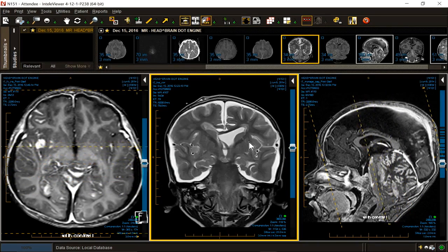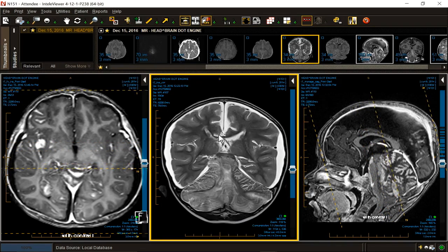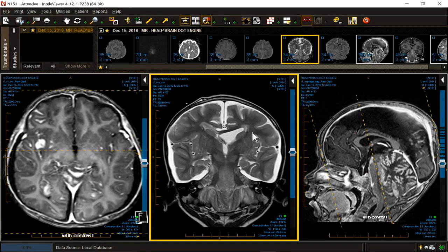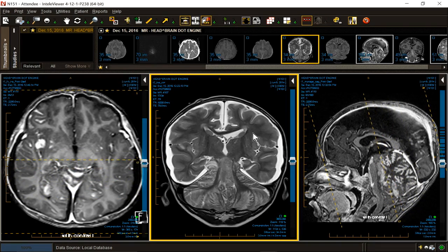Number two, the left lateral ventricle has not been decompressed. The right lateral ventricle is shunted and maybe over-shunted. Number three, pachymeningeal and extraaxial signs of low intracranial pressure. I won't say over-shunted or over-shunting with too much vigor because I don't want to paint the clinician in a bad light. Never do that. Leptomeningeal enhancement with at least one mass-like area consistent with dissemination or spread of medulloblastoma. Everything else is going in the body of the report.